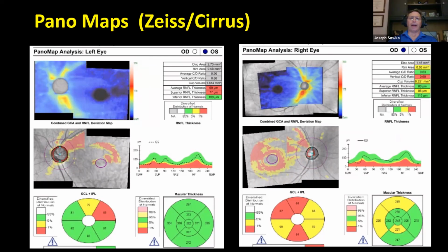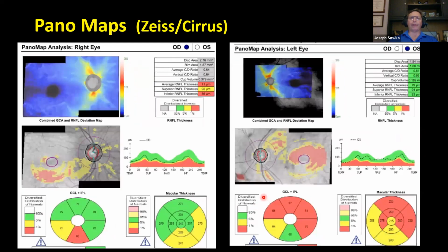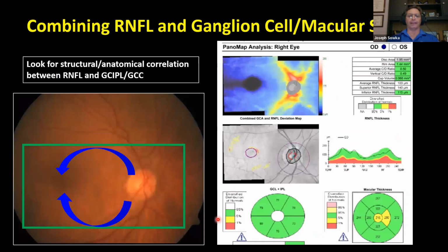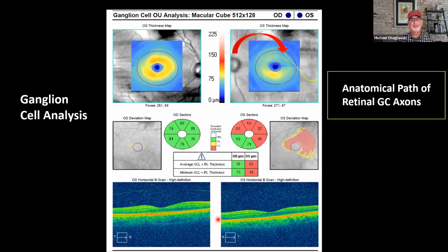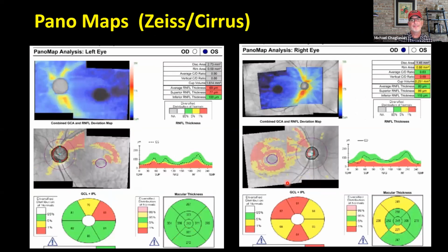Yep. Sometimes, like looking at one of your examples earlier, I started thinking about calling it the airplane neck pillow sign, because that's what it looks like. Where do I have one here? Yeah, sort of upside down there, but yes, I showed that earlier. Maybe we'll see it coming up. Yes, but these round cookie cutter things, be careful with those, is the bottom line.